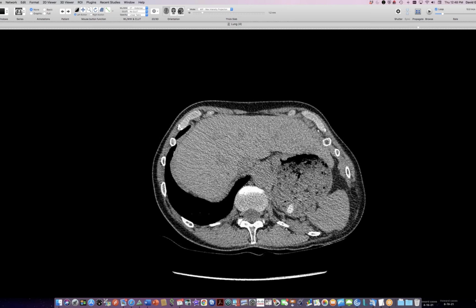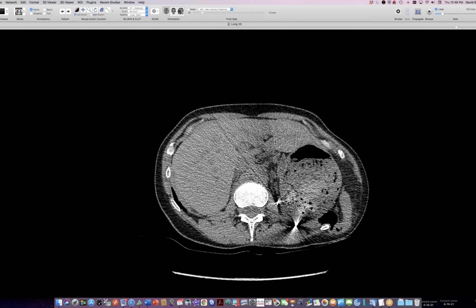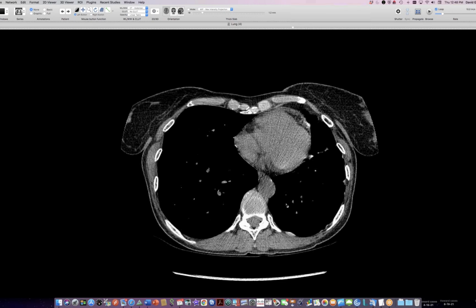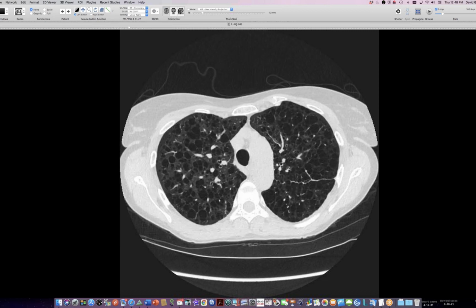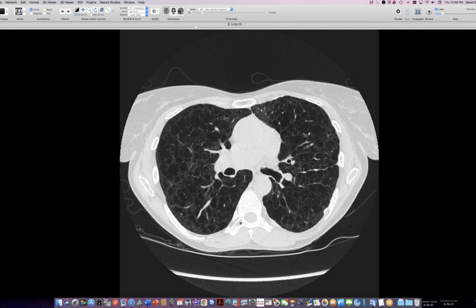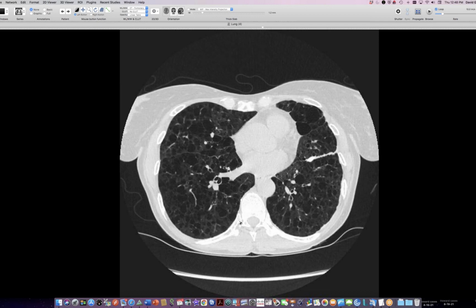And then in the upper abdomen, we don't get far enough, but she's got some clips from her left nephrectomy because of the angiomyolipoma, which I think must have bled for them to have resected it. So everything you could expect from LAM except chylous effusion. So that's the one element that's missing here.